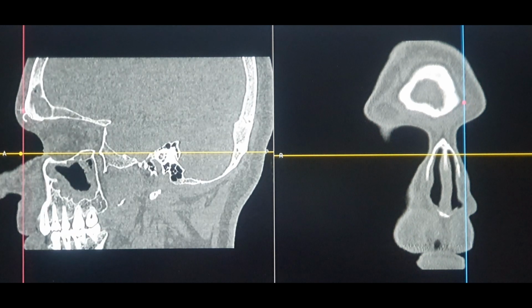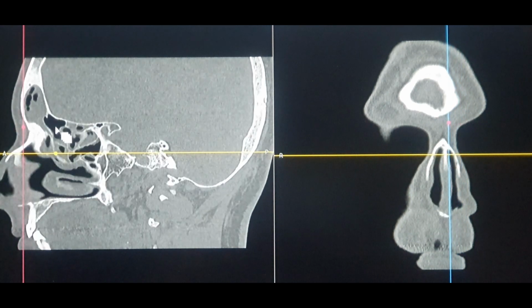So as you can see, my cursor is here almost touching the frontal bone, and I'm actually seeing the frontal bone on the coronal section as well. So you have to pay attention to both these scans to understand the sagittal section. So I'll start the reading of the sagittal section now. So to make it clearer.